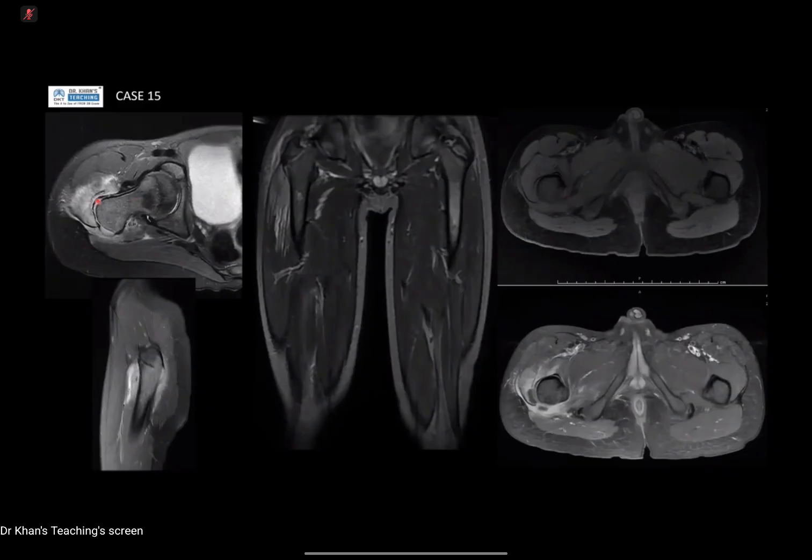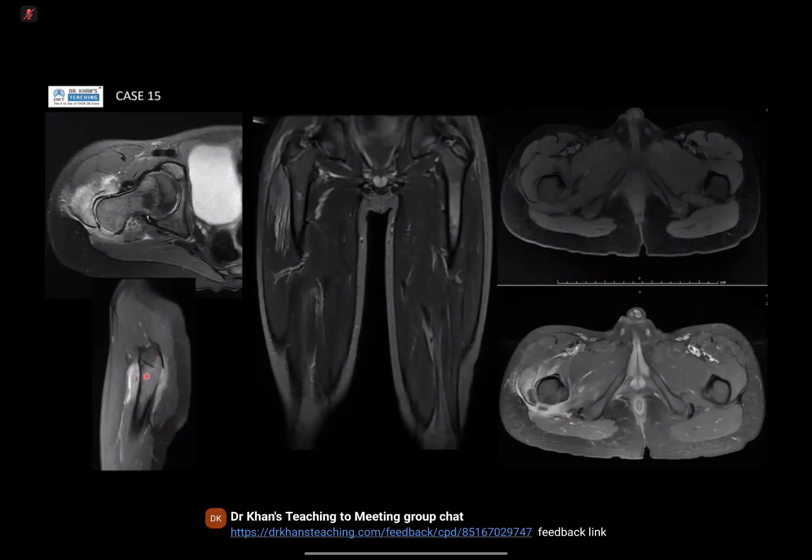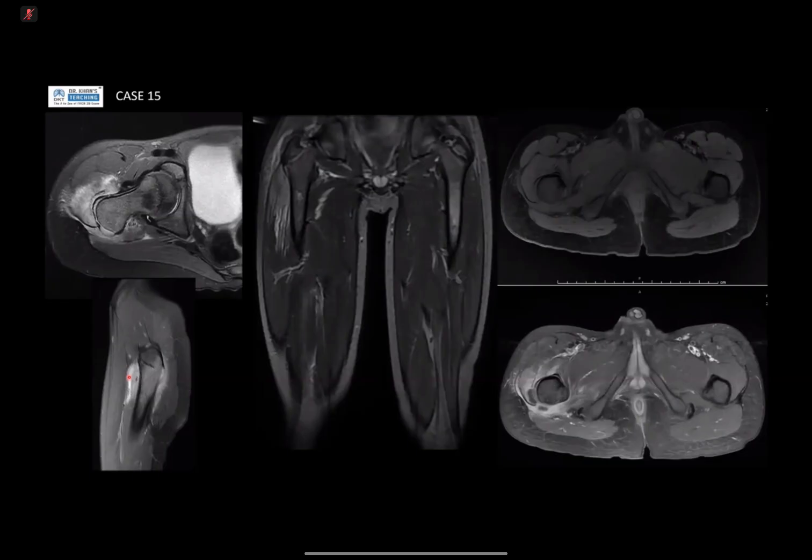So you've got soft tissue edema. You've got this periosteal elevation. And yes, this is a T2 fat suppressed, and you can see marrow edema as well here between the greater trochanter and the epiphysis, the metaphysis. And this is apophysis, which is similar to epiphysis, just that it doesn't add to the lengthening of the bones. Okay, so this is apophysis, and this would be the metaphysis, as you normally know in your long bones. Soft tissue edema, that shows you again on a coronal.